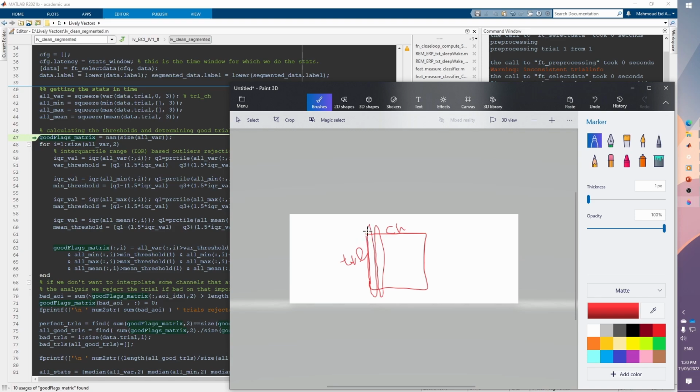So I'm basically extracting data from every column, and then I'm going to build a distribution of these different data points inside of here, and then I'm going to see the 25th percentile of data, and then I'm going to check the 75th percentile of data.